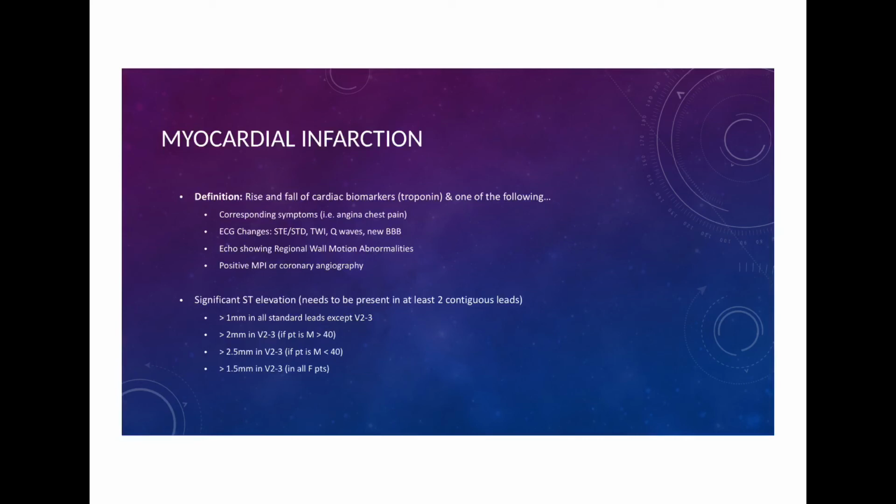And there are criteria for determining whether ST elevations that you see are significant enough to be concerned. You need to see at least 1 millimeter of ST elevation in most leads, and you need to see it in contiguous leads as well.